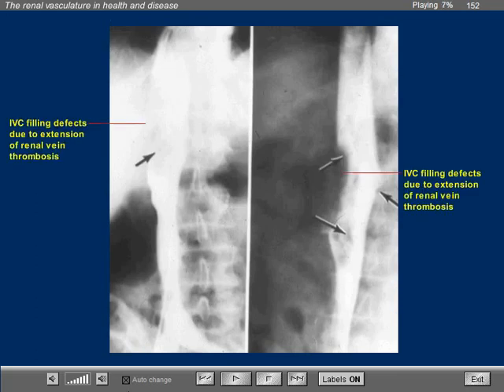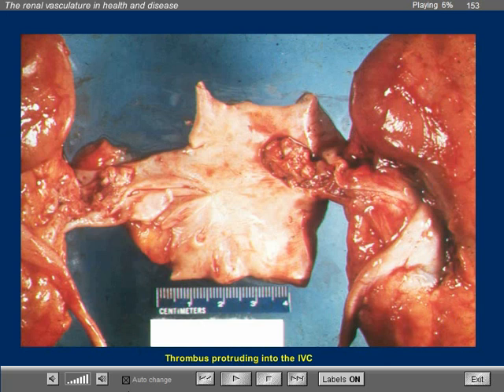These are two patients with renal vein thrombosis associated with medical nephropathies. Both were inferior vena cavograms revealing the presence of extensive filling defects due to thrombi. And again, note the absence of the streaming effect that should be seen as unopacified blood from the renal veins enters the lateral walls of the inferior vena cava. This patient with amyloidosis shows the presence of thrombi in the renal veins, and on one side the thrombi protrude into the inferior vena cava.